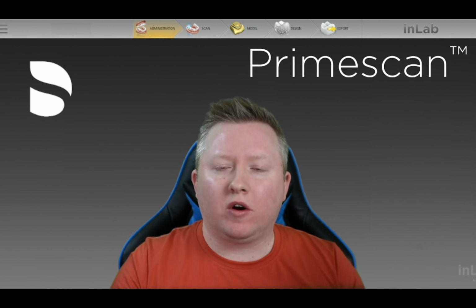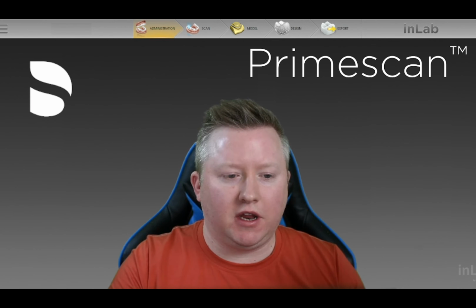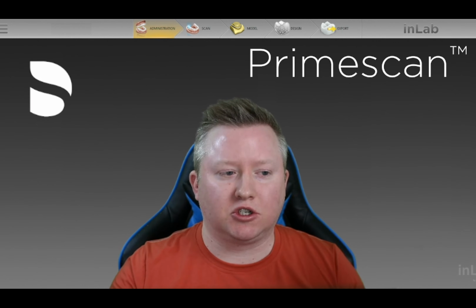Hey everyone, welcome to a fundamentals video in inLab for denturists. Today we're going to be taking a look at a 3D IPN setup with a reference denture workflow.